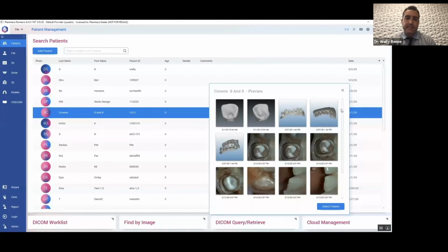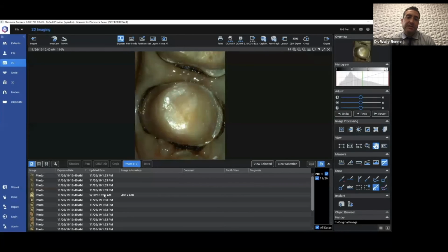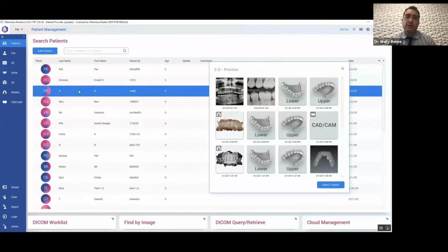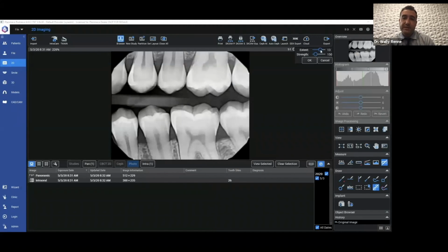It's ultra fast, and you can see here we're just jumping from patient to patient, and all that patient's information is instantly available, even through a true PACS type system if you want. It's all networkable as well, so you could have it on multiple different machines. Like here at the university, we have it on 53 systems.